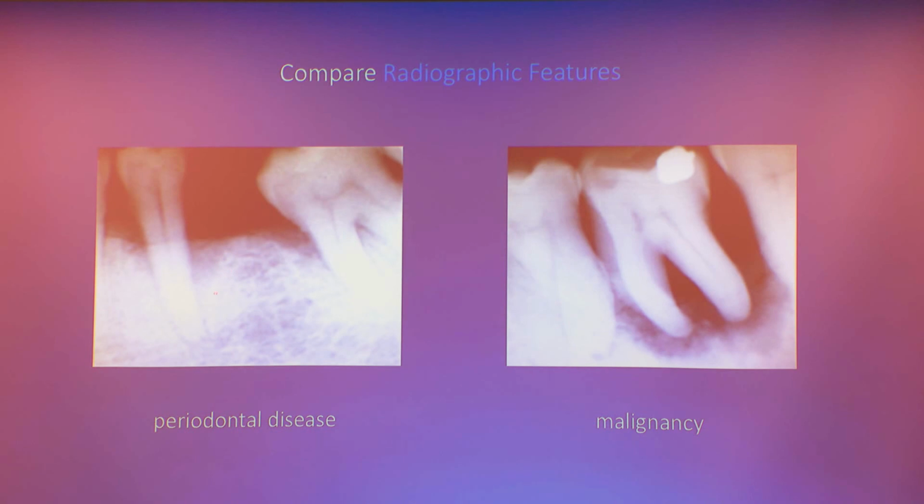And then adjacent to it, the bone is a little bit more dense, but then after a few millimeters, we get back into normal density and pattern of the bone. That suggests that this is a chronic, slowly progressing process. The body is able to keep a wall or an edge of bone intact, and it's sclerosing adjacent to that edge to protect it, to protect the normal bone. If you look over here, there's no edge at all.